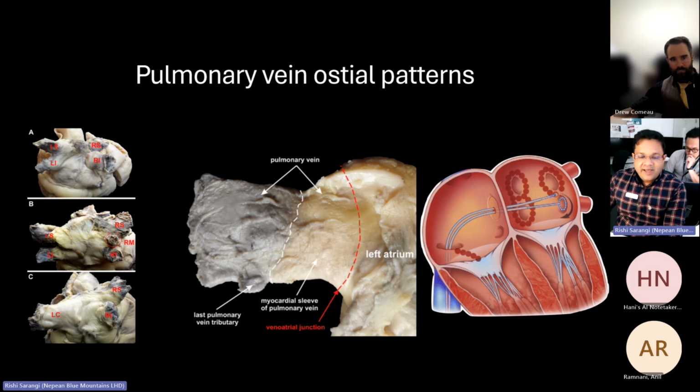This is where they sometimes insert the balloon or the catheter and do this cryoablation or radiofrequency ablation. If the small tributary veins get occluded or destroyed, there's a high likelihood that the patient will develop pulmonary vein stenosis, and the area which they drain won't be draining, and the patient will end up with more pulmonary edema or shortness of breath. This is how the EP studies go through the vein, do a transseptal puncture, and do a figure of 8 ablation. This is how they prevent those ectopic beats from coming from this myocardial sleeve and extending into the entire left atrium.